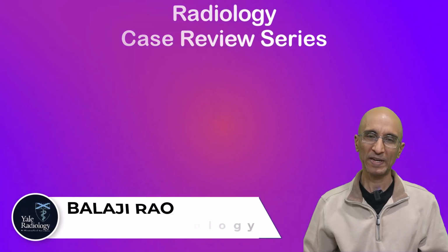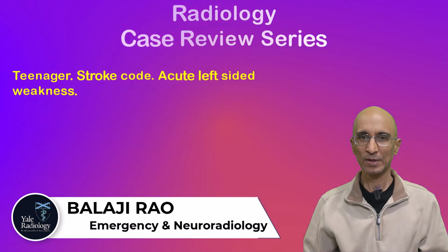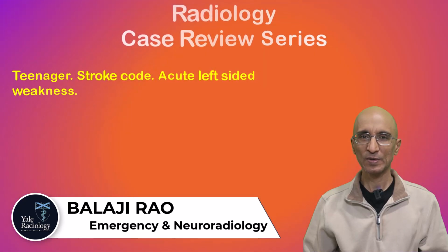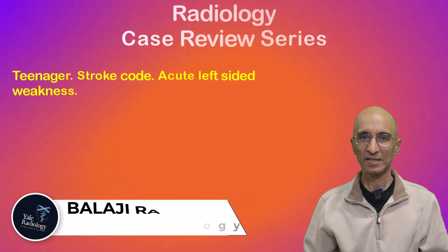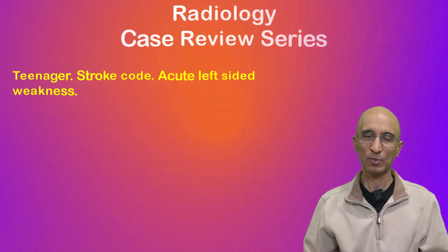Hello everyone, in this video we are going to look at images of a pediatric patient who presented to the emergency department as a stroke code. Patient presented with acute onset of left-sided weakness. Patient initially underwent CT head and CT angiogram as part of stroke protocol.